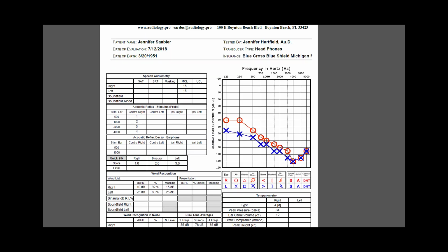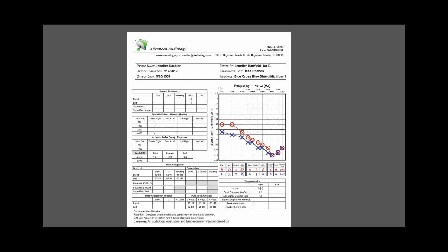But that's the report that we just created in a few seconds. It makes it real easy, and the assigned audiologist for that audiogram has his or her signature automatically displayed at the bottom of the report. So as I continue, again, you can't quite see all of it, so I'll make it a bit smaller. The letterhead, of course, is automatically put at the top of these forms based on the assigned office location. And this is a full-page audiogram, not much on it because it's just sample data. But I asked that it be included in the email or the fax, and that may have value if you want to include a larger document.